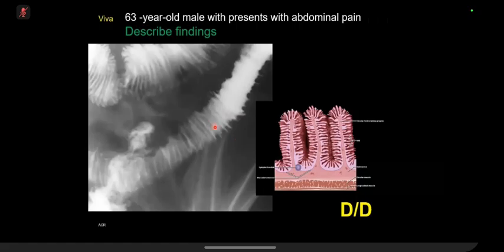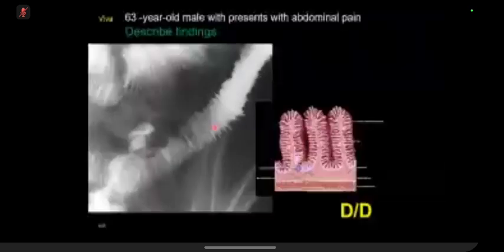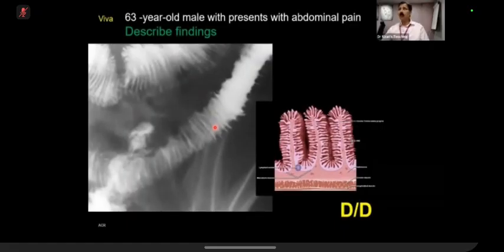Okay, there is spiking from the mucosa, and there is a fistula. I couldn't identify this bowel loop. However, there is a thickening and there is a spiking with a thumbprinting appearance. Excellent. Well, thank you very much, number 11. Next will be number 12, but let me take over on this case.